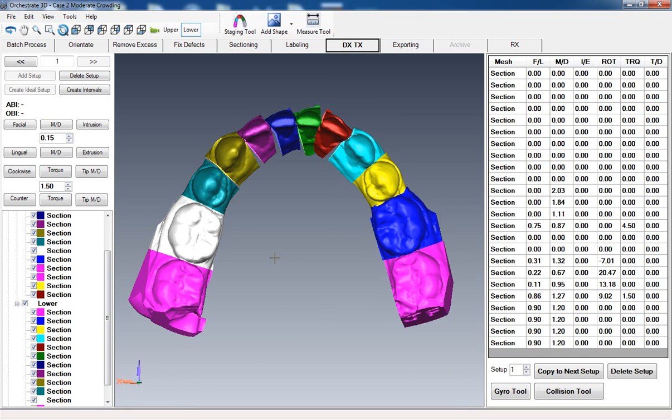The way I look at this is like golfing. Right now we're on the tee box, just trying to get to the green. So right now we just have our driver out, and that's what we're using. When the patient's closer to the finish, that's when we'll do all the fine tuning. Right now it's about just moving in the general direction, getting us in the ballpark.